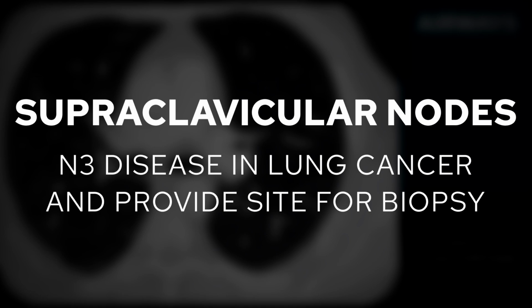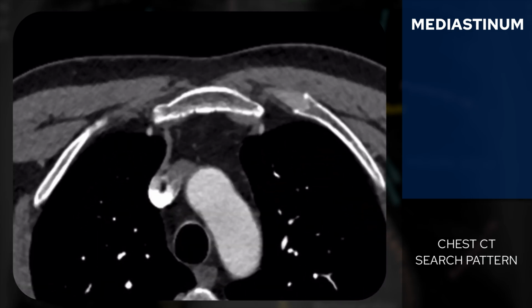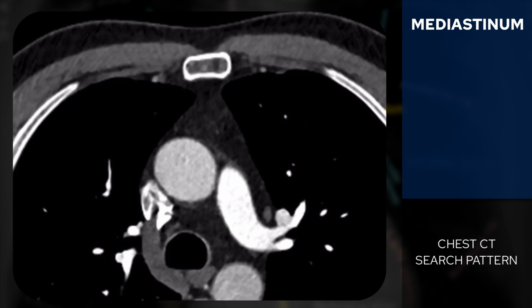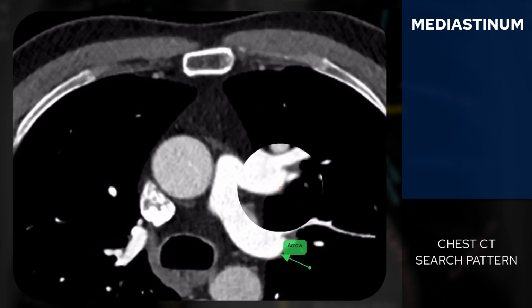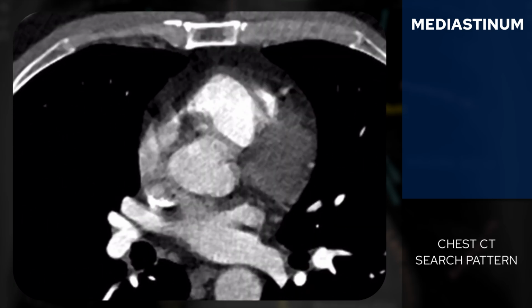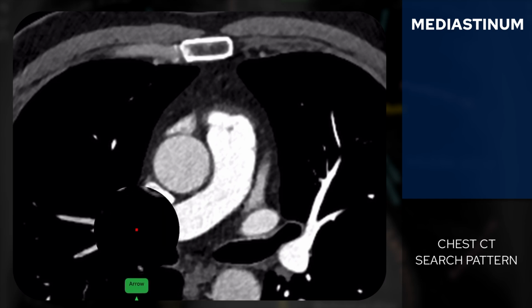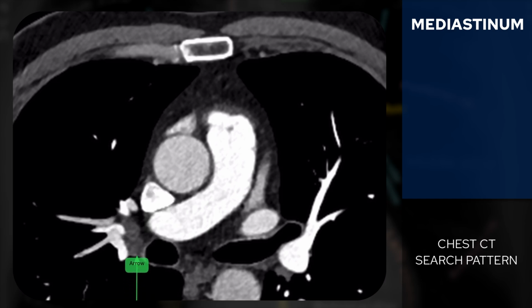Also, if you see nodes in this region in the context of cancer, it means that potentially there's a site that may be easier to biopsy than something that's well within the chest. So I like to then review the rest of the mediastinum. So then I'm going to scroll back down and I'm going to look in and around the trachea. So we're going to look in the paratracheal region over here. That looks okay. And then I'm going to look at my hilar regions as well and look for any lymph nodes. I can see some small lymph nodes over here. These look okay. If you're unsure, you can measure them.